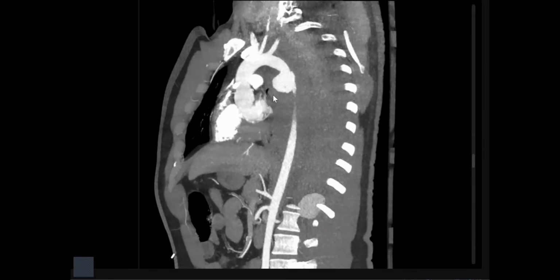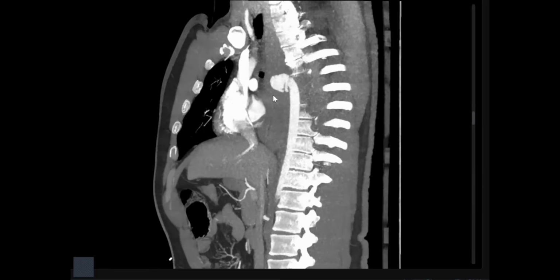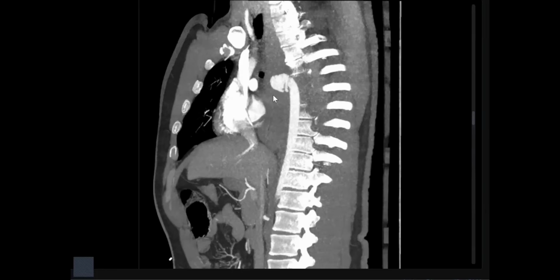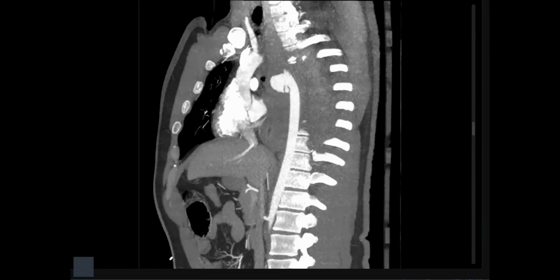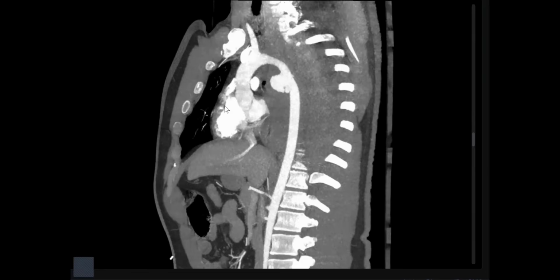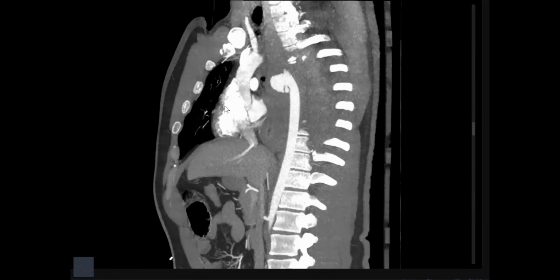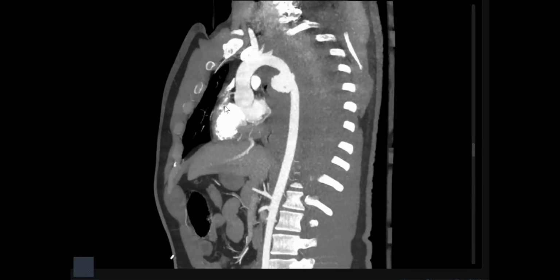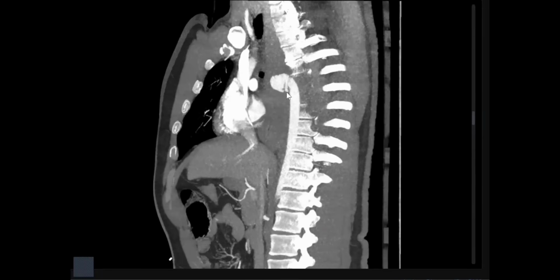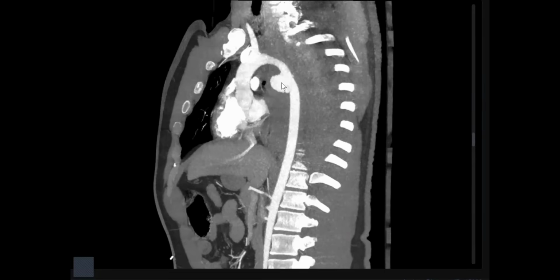There is a circular aneurysmal dilatation noted in the posterior aspect of the descending aorta, extending into the arch, and the wall of the aneurysm appears irregular. However, there is a hyperdense collection noted around the aneurysm, but there is no active extravasation noted at the aneurysmal site.